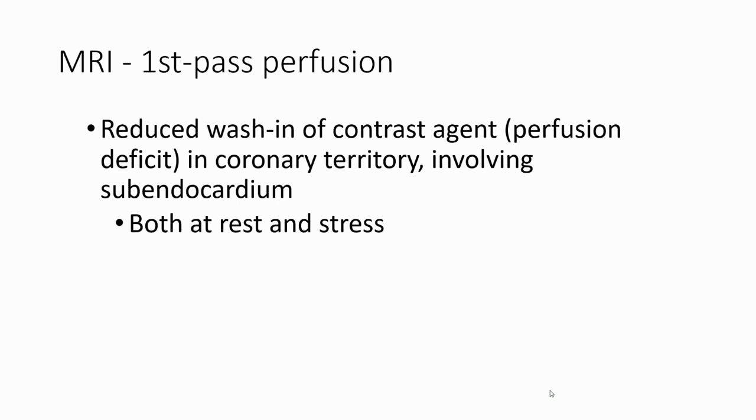First pass perfusion. Previous findings reduced wash-in of contrast agent, a perfusion deficit in the coronary territory involving the subendocardium, both at rest and stress.